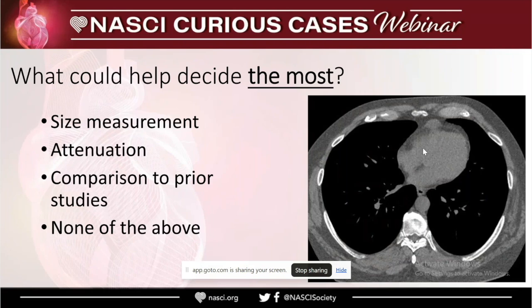Okay, so first of all, because we're going to deal with the heart, you can probably see that we have a lesion in proximity of the heart. The lesion is right here in the anterior mediastinum. So what is it in close relationship with, and what will be the differential diagnosis because of that proximity? You can probably see that it's in very close relationship with the pericardium.